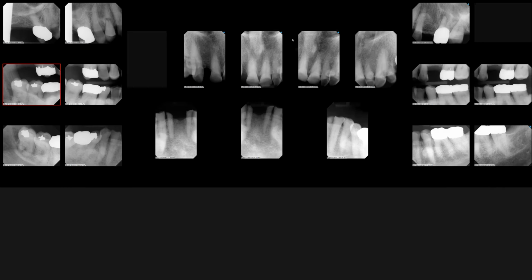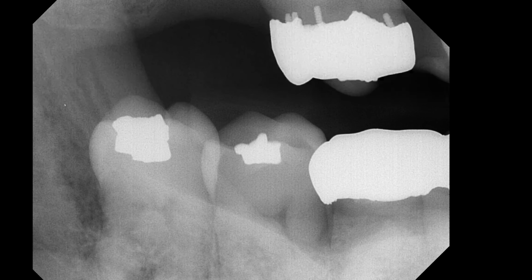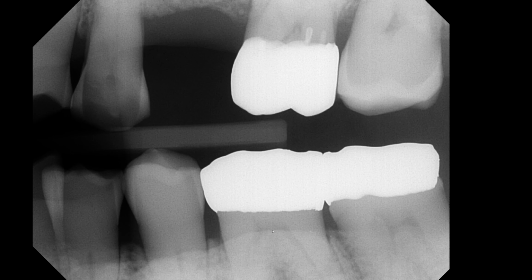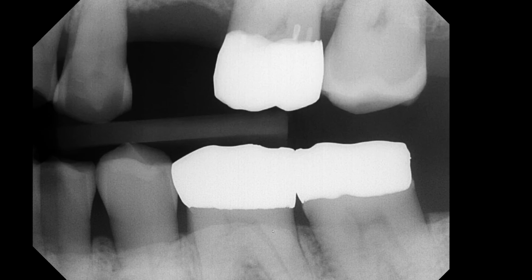Let's see. Okay, so we didn't have that one, so it jumped to the bitewing radiograph. Here's the anterior border of the ramus, and this opaque border is the external oblique ridge. And the alveolar crest, of course, and the other side. Okay, so just the alveolar crest.